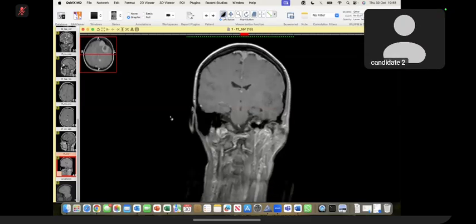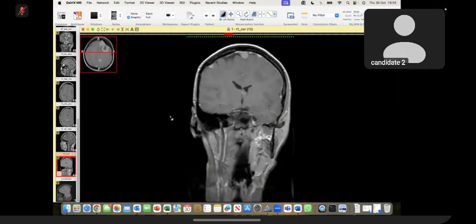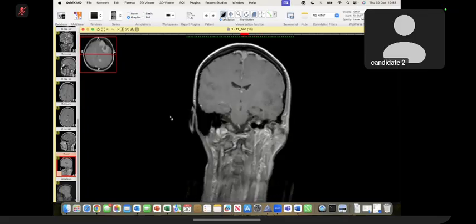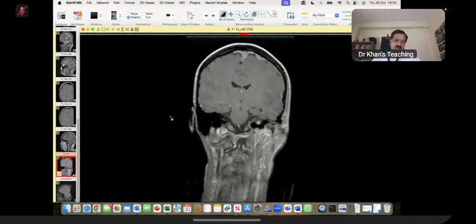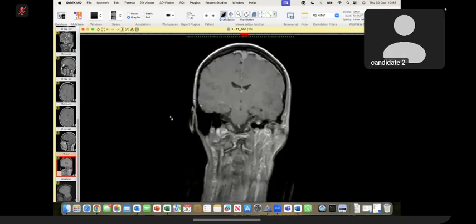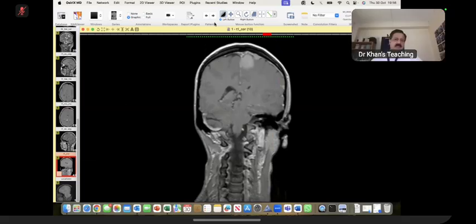Schwannomas. Of which nerve? Sir, internal auditory canals. Do you see anything there? No, sir, no significant enhancement. Okay, thank you.